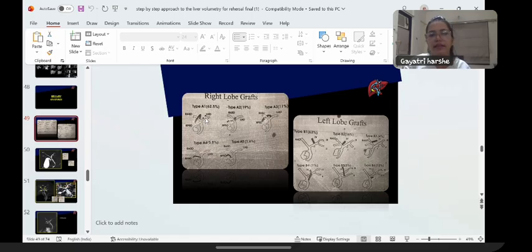If, in a scenario, the segment 4 duct joins the right hepatic duct, then this is not amenable for right lobe transplant. So that way, it's not about identifying the type, it is the length as well as any variant anatomy, whether the quadrate lobe duct is draining or is dominant. All those things we need to mention.